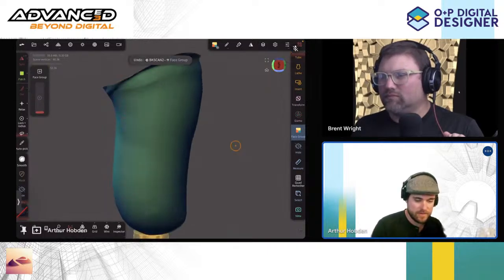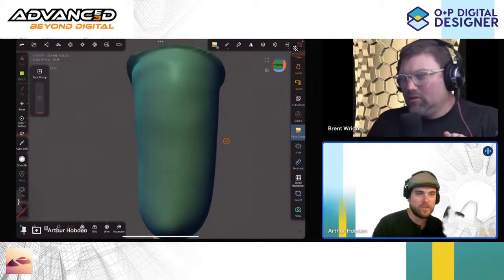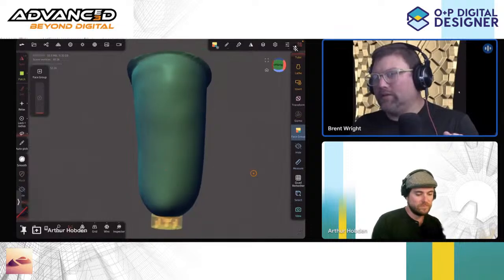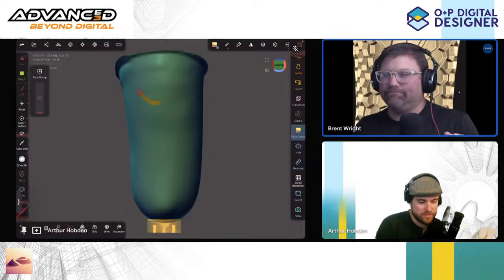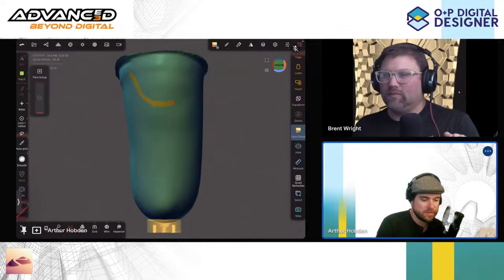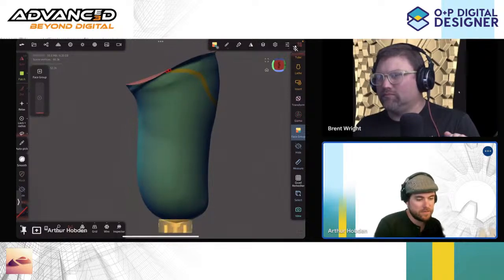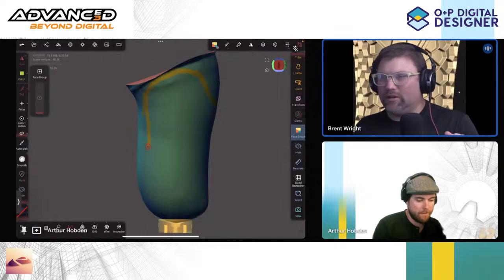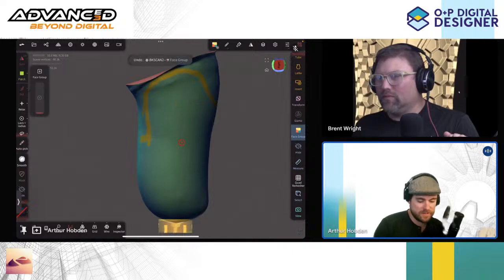So where do you start with your trim lines when you first start drawing? You start in the front? Yeah. So I will start kind of right proximal to the patella. Yep. Okay. Something like that. Coming up. Yep. Looking at from the side. Hopefully I have enough of a scan. I think I have enough scan. Yeah, you can be under that crease where it kind of flares out. Okay. And so when you do with this height to this height, what's the rule there? Is it generally lower?